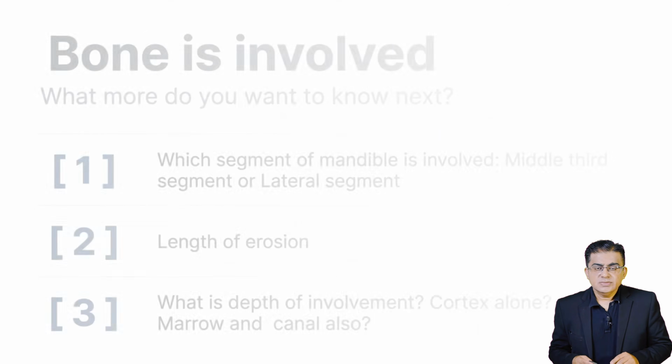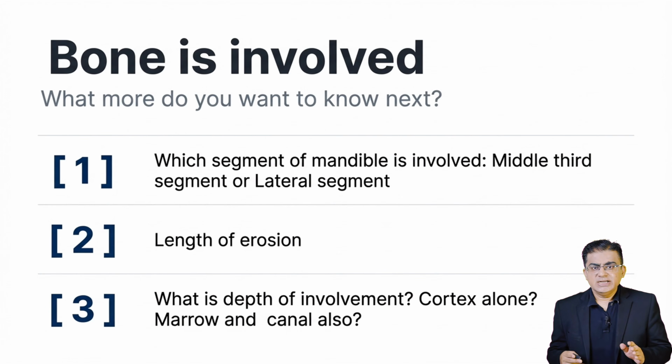Okay, so we have spent quite a lot of time learning how to use a CT scan to definitely prove whether or not the bone is involved. But here is the hard truth. Just knowing that the bone is involved is not enough. You cannot just look at a scan, see a cortical break, write T4A in the patient's file and call it a day. If you do that, you are walking into the operation theatre completely blind.